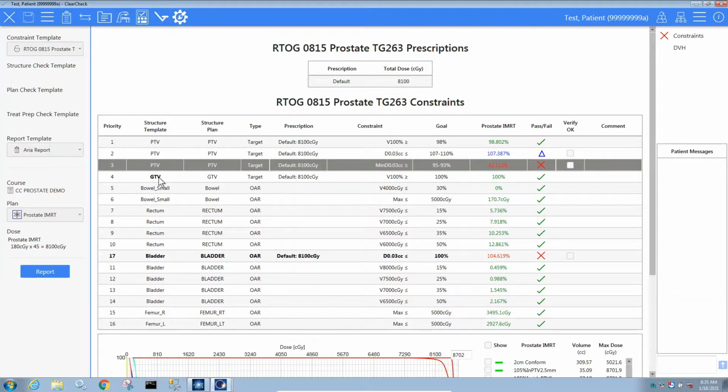All right, so I just want to talk about a few more things before we head back into Template Manager and assign the rest of those templates. We're going to just discuss the interface here in this main evaluation window very quickly. So I briefly talked about this left-hand side panel here. We have all of our information, our templates listed here, which plan we're reviewing.